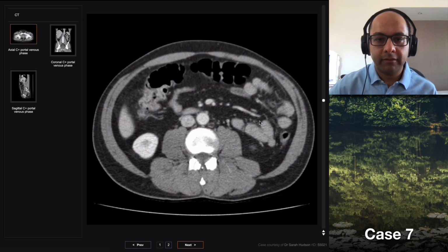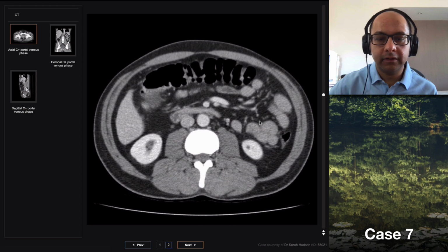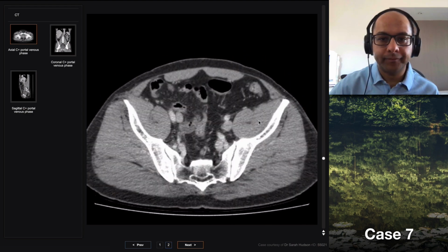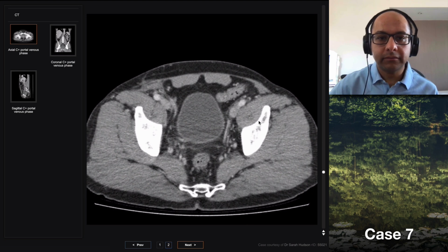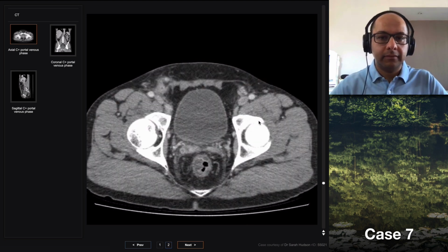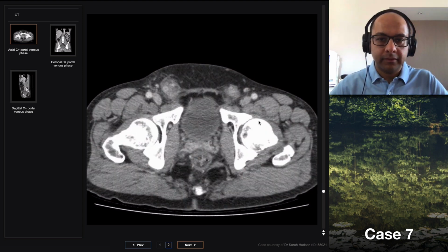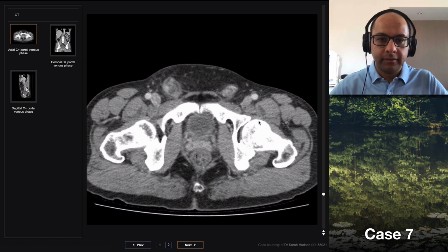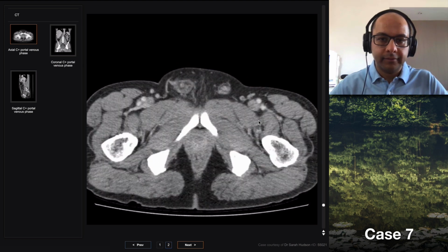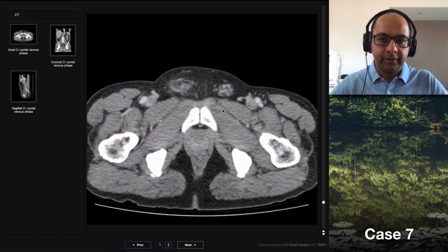Sure. I've started looking at it, and it's a CT abdomen and pelvis in a portal venous phase. Just scrolling down, you mentioned the right groin, and in that area you can see fat stranding as a tubular structure enters into the groin, not the inguinal canal, sorry.